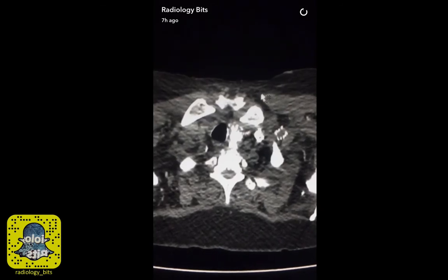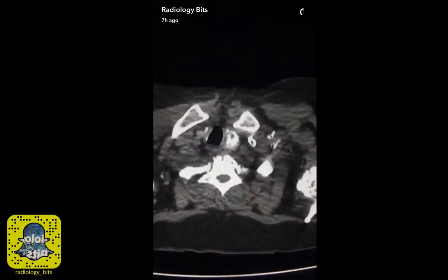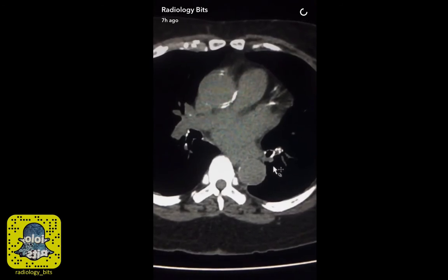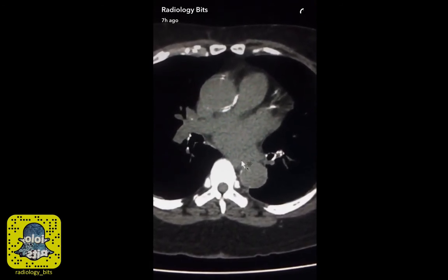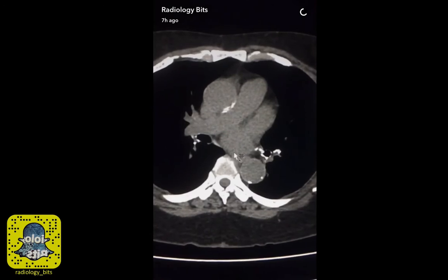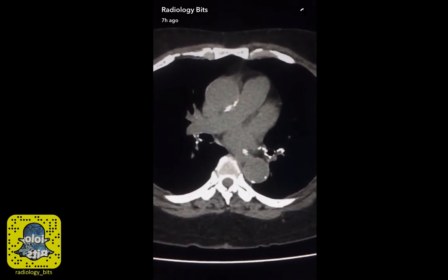So what did we learn today? For juniors, we reviewed the vascular anatomy. Even though it's difficult without IV contrast, now it's easier to understand. For seniors, not everything that's high density is a calcific lymph node. Make sure to exclude metallic densities. And remember, we have two types of pulmonary emboli, thrombotic, which is the common, and non-thrombotic, such as this case.